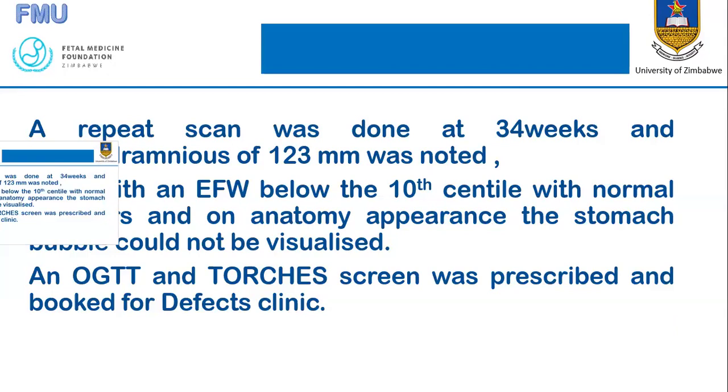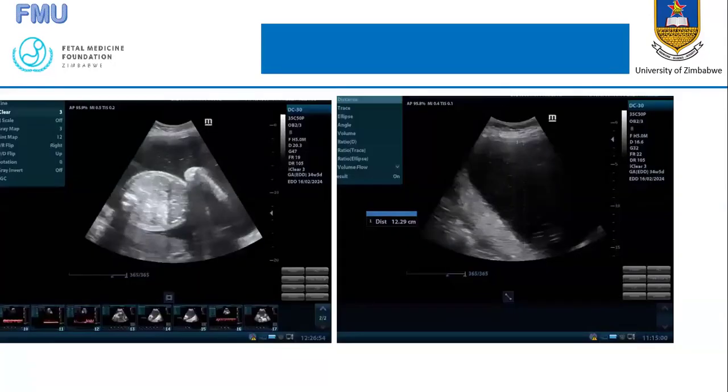You can see the image on my right, showing the vertical measurement of the deepest pool of amniotic fluid, and you can see that there are no fetal parts present there.